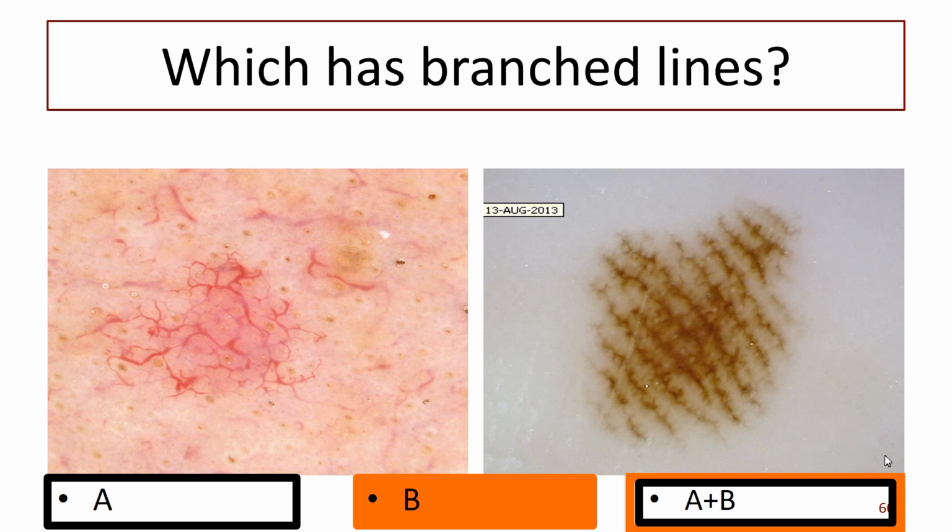No, you can't have a reticular pattern. I was hoping you'd say that, because you can't have a reticular pattern on the palms or the soles. So when you have this fuzzy pattern, it's not called reticular. In fact, this is called fibrillar. But what we have, in fact, is lines going in the other direction, but they actually form more of a lattice when they do join up. These aren't joining up, and when they don't join up, they're just called fibrillar, and when they do join up, they're called lattice. Do you understand the difference, lattice? It's like bricks. If you can draw some bricks, it'll be the lattice.